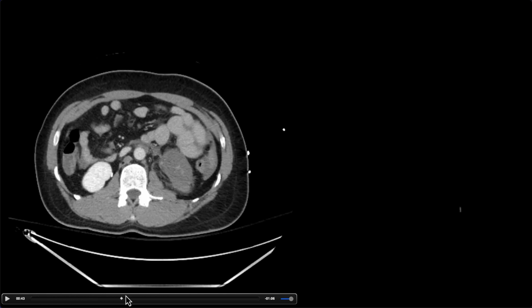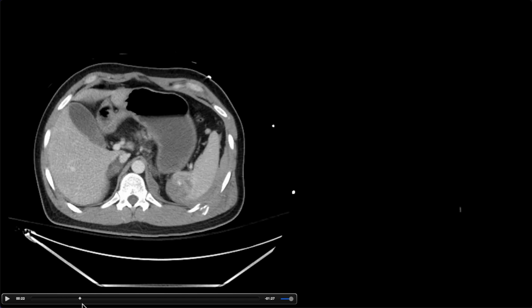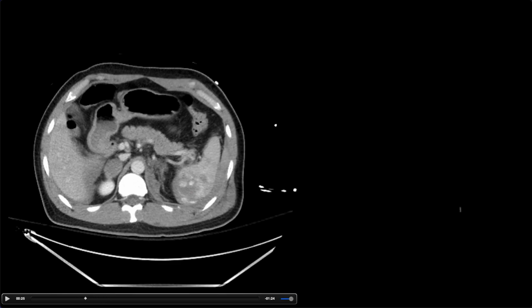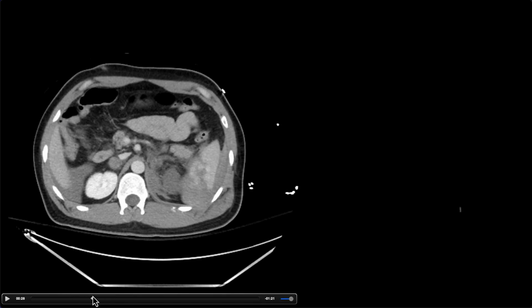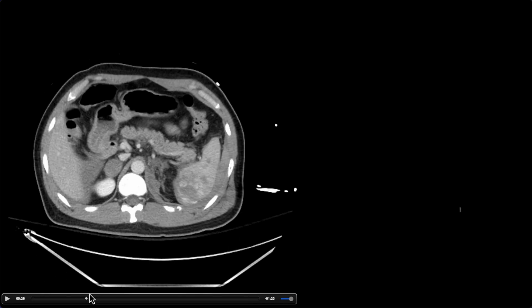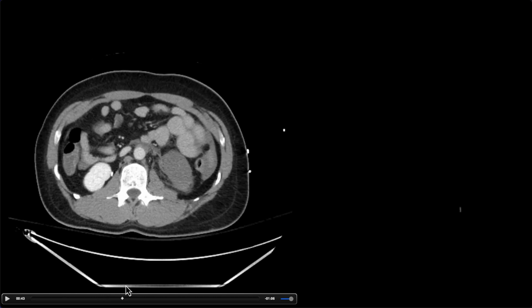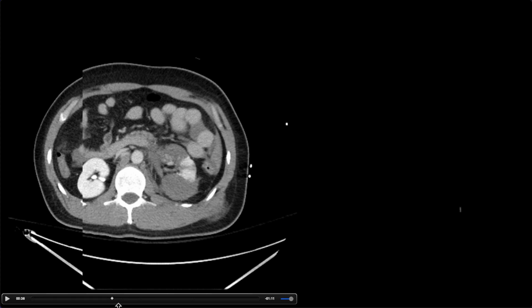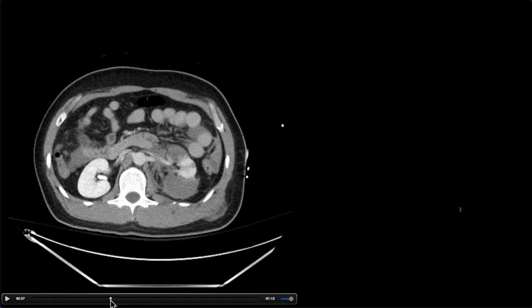And this is a patient presenting with trauma. As you can see, there's multiple areas of hemorrhage and small areas of bleeding within the spleen with hemoperitoneum and some other injuries of the adrenal glands. But we're here to focus on the kidneys, so let's stay focused on that left kidney. Okay, so much of that left kidney looks like it's completely infarcted. There's some other striated areas of infarction as well. And this is an important complication of trauma to keep in mind.